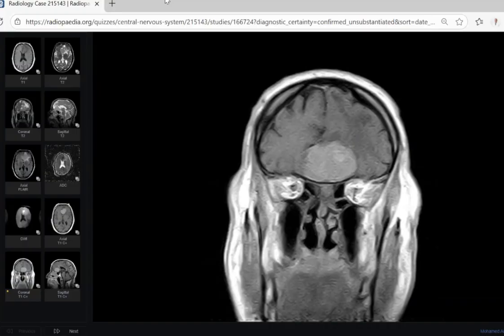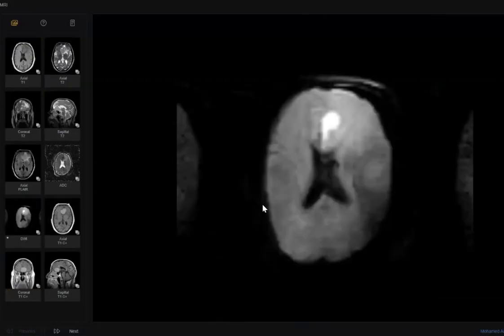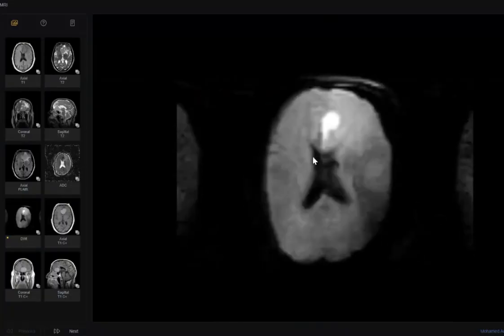Okay, but keep in your mind, this patient has fever, and he gives you a brain MRI: search for infection. This patient has sudden onset of something urgent: search for sudden onset, either bleeding or infarction. That is all. You will find this one, and immediately, if you didn't forget, you will look at this. Doctor, there are restrictions. Doctor, at least I'm worried about infarction. This is the lesion, by the way.